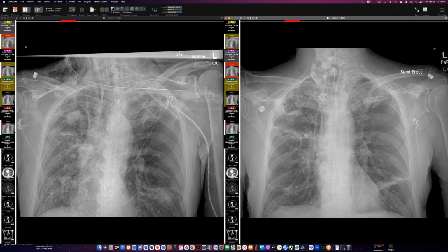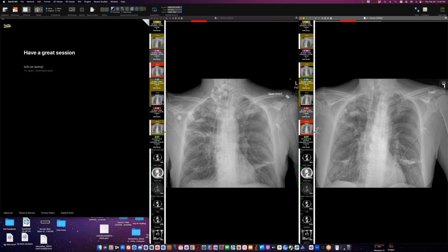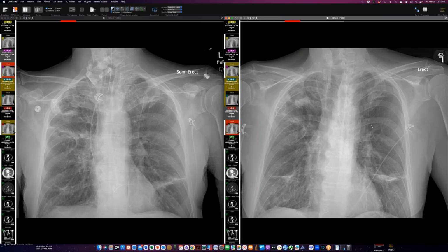But let me compare, instead of this image, let me show you the pre-intubation image here. I'm going to get rid of this one. So for one thing, with intubation, the left lung gets clearer, and the mediastinum, I had some imaging where this comparison was more striking. The mediastinum shifts slightly to the right on intubation, and it wasn't that way before.